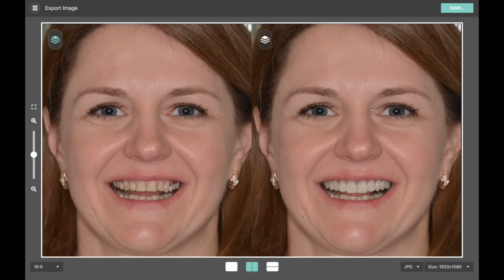So this concludes our basic introduction. In other videos we'll get into more in-depth treatment planning and go through more advanced features of how you can take your smile design and actually integrate it into a fully digital workflow. But before we say goodbye, we're going to go through this whole case start to finish without talking, just so you can see how fast it is to use once you get comfortable with it. So let's do that.